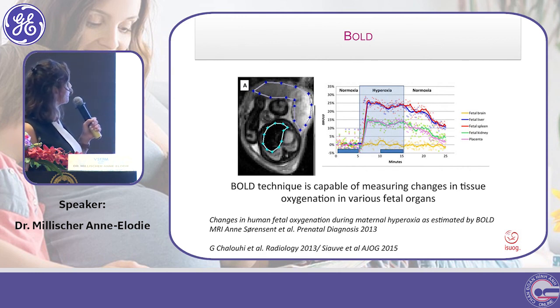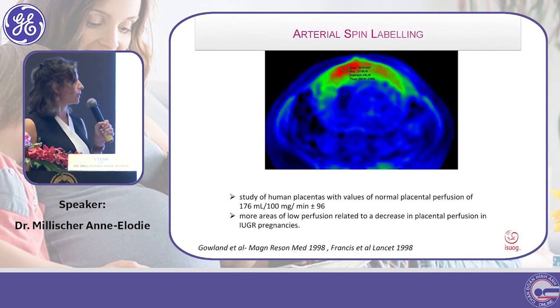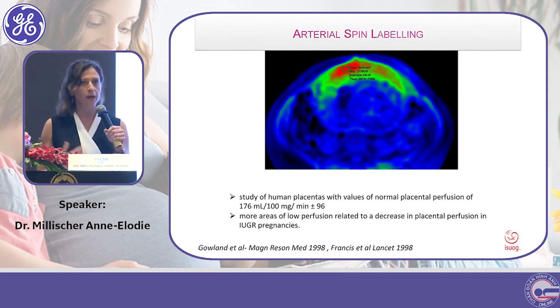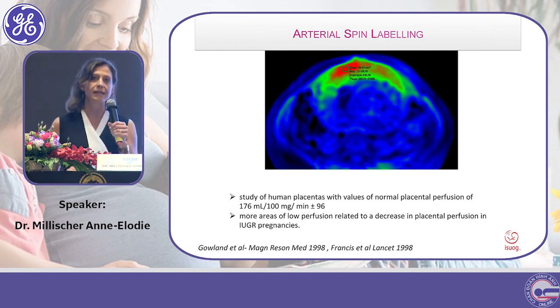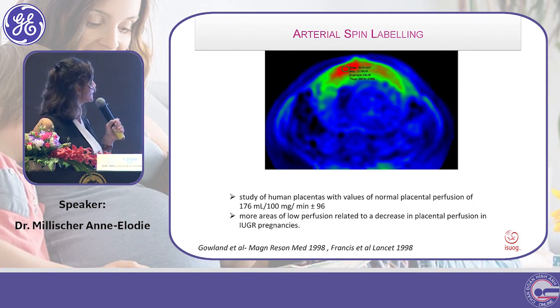And here you have the example of BOLD technique. And more recently, a subject we are working on at Necker Hospital, it is this arterial spin labeling.